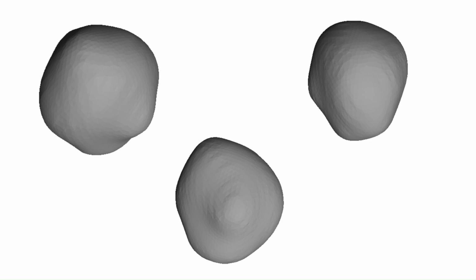They can also do some pre-surgical simulations and try to reduce the risk of the surgery, and they can also use this and plan treatment for radiotherapy. So they can even calculate the dosage of the chemo they're using. They can also monitor the growth of tumors. This will also be very beneficial for new surgeons and students. Without further ado, let's get into 3D Slicer.